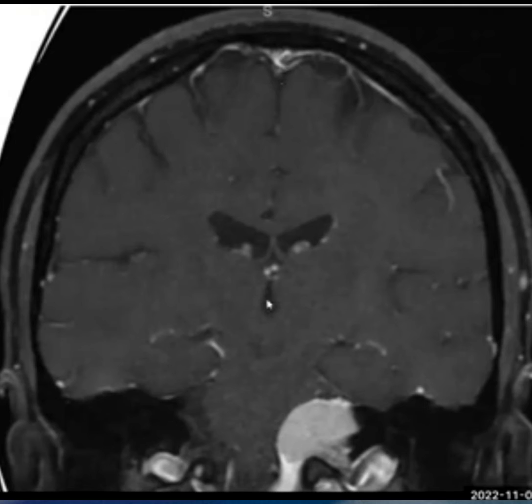And the third one is sagittal. For sagittal, our goal is to cut the body visually in the center, so we get the left and right sides. For that, we can actually use both planes, axial and coronal. We have anatomy in our body that's really symmetrical.